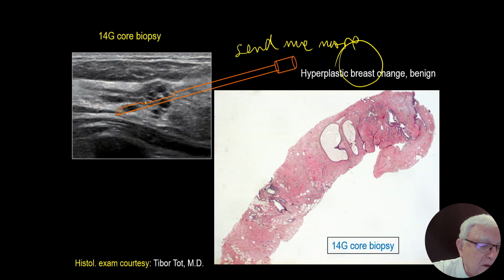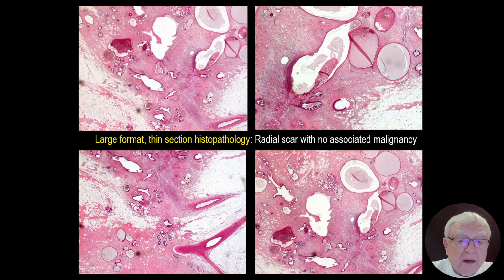Because you gave me tissue from here. But I don't know what's in here. I don't know what's in here. Here is the result. Did we talk about fluid-filled duct-like structures? Yes. Here is one. Did we talk about cystic cavities?